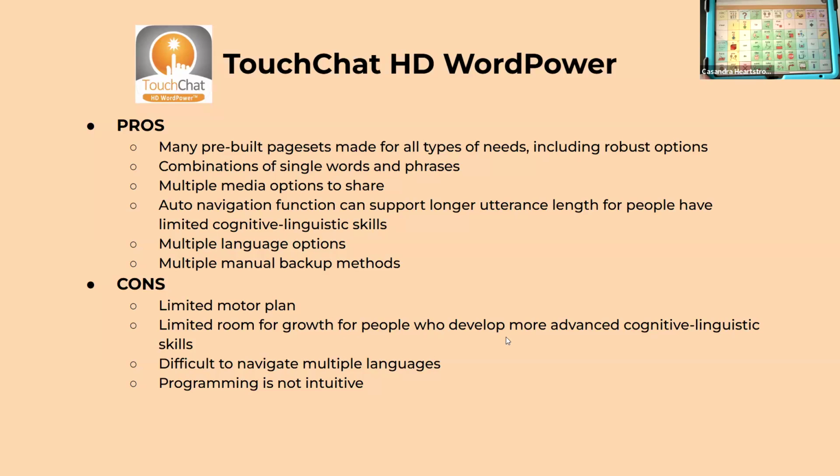It's difficult to navigate multiple languages. If you've got somebody who uses Spanish, you have to do some deep setting editing in order to make it easier to move between both languages. So you can go to the English page and then bounce over to the Spanish page. It takes some deep editing to be able to do that.